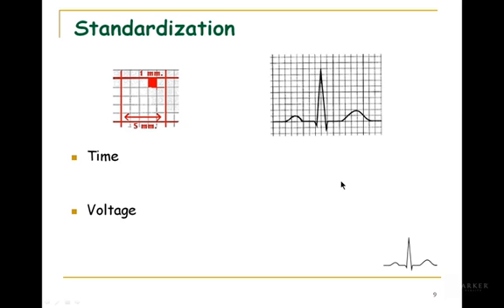What about the Q wave? Here's the Q wave. That's a downwards deflection. That's one box, but since it's downwards, we're going to say it's minus 0.1 millivolts. What if I asked how long it took for the ventricles to depolarize? You should know that the QRS complex represents depolarization of the ventricles. To make it a little bit easier, we're going to say it started right here in this line.